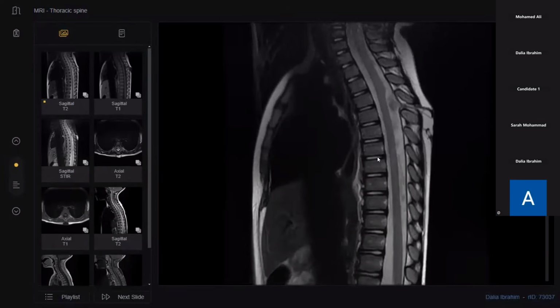at the upper thoracic spine, which has well-defined margins, and its overlying skin is not intact, and there is a fibrotic band starting from it. Amna, you are amazing, because you have described the anatomy of the disease.